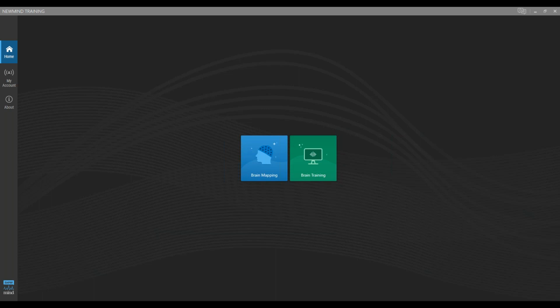But with photic, you actually get a pulse of energy in that cable that connects the glasses to the amplifier. So if that glasses cable is near or touching one of your sensors, especially if it's an active sensor, like a channel 1 or 2, you can pick up interference there as well.